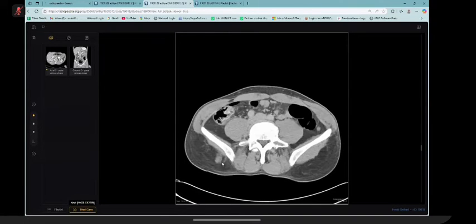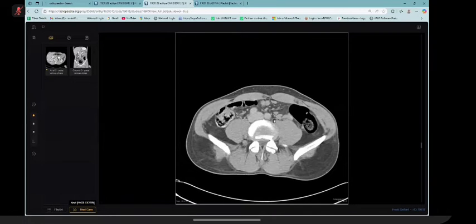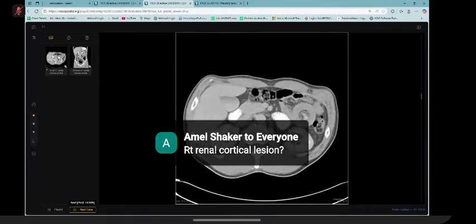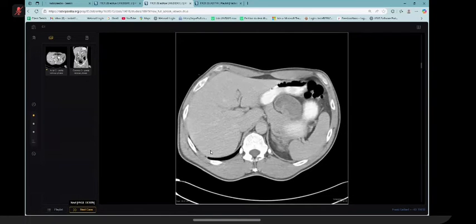intussusception. If you could check over here, there was a lesion, though it was not dermal, but this lesion, if you could have picked it up, it would have been better. Are you able to see this lesion over here? Are you able to follow my arrow behind the iliac bone, right iliac bone? Yeah, this one. Okay, so that was another lesion which I wanted you to take up, and I wanted you to also correlate it with the malignant melanoma.